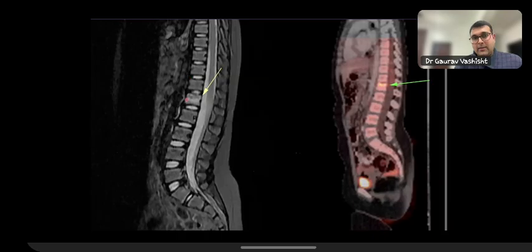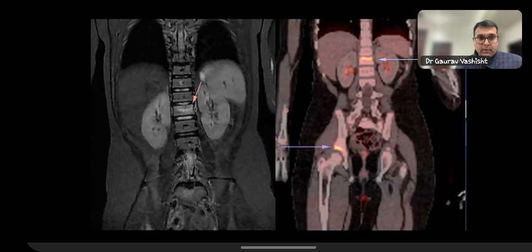So this patient had a single vertebral end plate fracture. Just out of nowhere, one fine day, she had pain. An MRI was done for the hips, the SI joint, and the lumbar region. And SI joints were fine. There was just one area of bone marrow edema in this vertebral body with a thin end plate fracture. Okay, and this was the only image which I could get, and I could see there was a subtle marrow edema on the right acetabulum region on the right hand side, but there were no hip images.